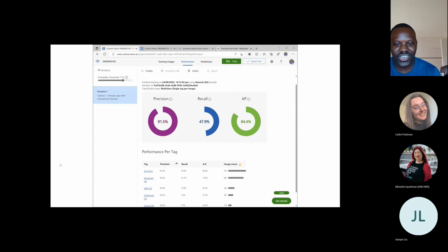And so what they're doing is something they call transfer learning, where you apply a model from another field, not from this particular mining or grinding area. They take it from another field, tweak the parameters a bit, and try to use it here to see if they can get a good prediction. That's a subset of machine learning, and it is a reality. So ideally, as much as we want a balanced set of images, we may not have that, and we have to work with the constraints we have. I wanted to demonstrate this: there are more images here, but you'll find that the earlier model actually made better predictions.